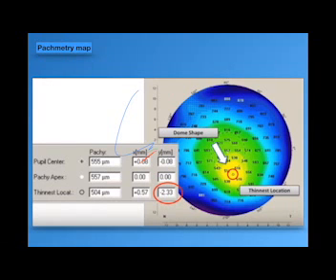So this patient is a candidate for OCT. The anterior segment OCT will measure the corneal thickness more precisely and accurately than the Pentacam, to get the real thickness of the cornea at the scar point. And there is a new device now combining both Pentacam and OCT to measure such situations.